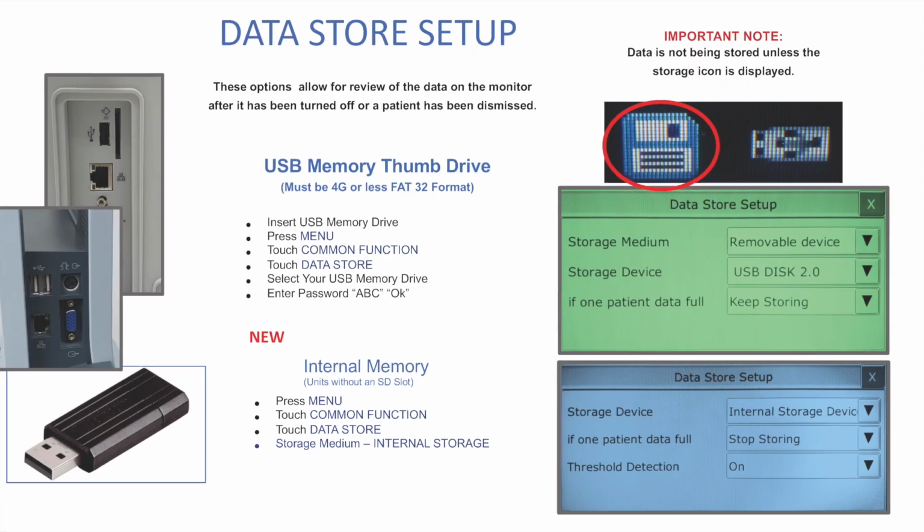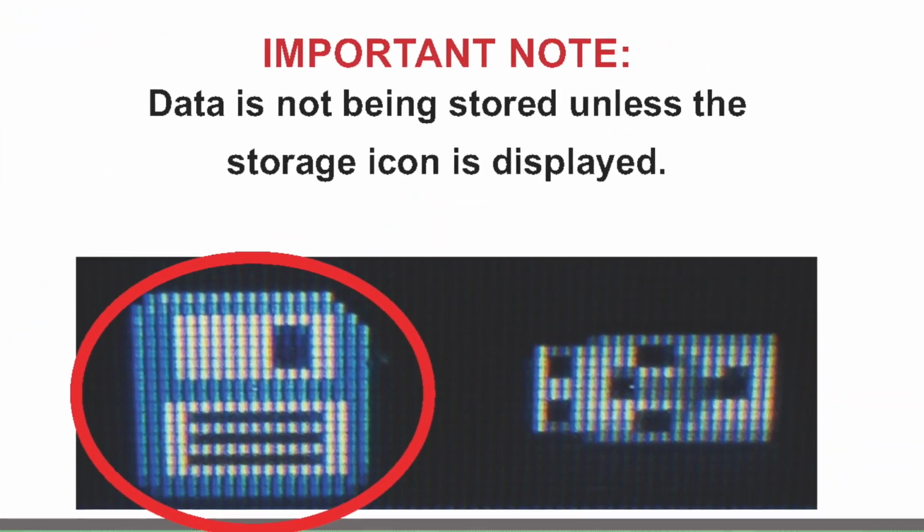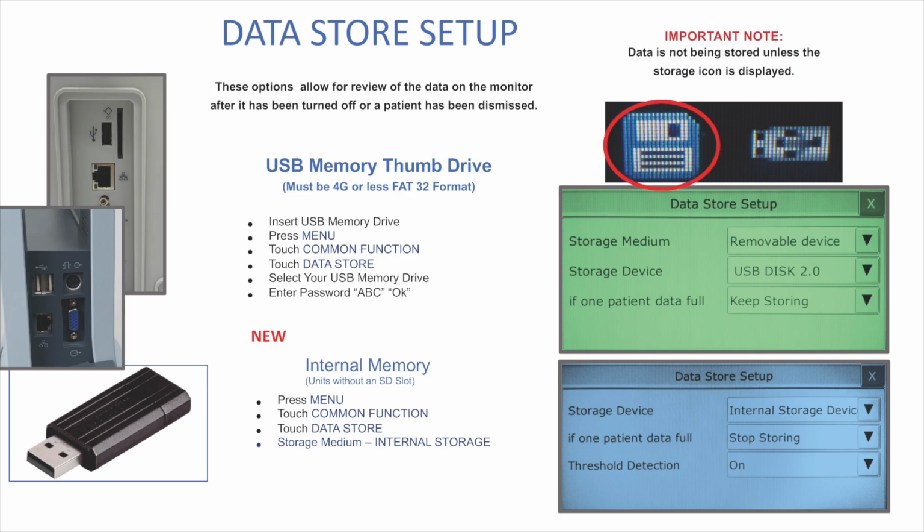To confirm that data is being stored on your patient monitor, see the important note. If these icons are not being displayed on the bottom of your monitor, see the instructions for data store setup.